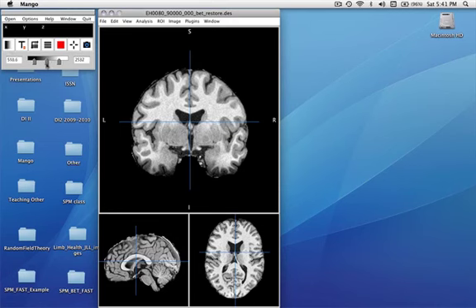So if you've set it and you forgot what it was in the beginning, if you triple click this, it'll set it back to the beginning. And if you move it around and you like it better, if you double click this, it makes that the current range for you to work with.